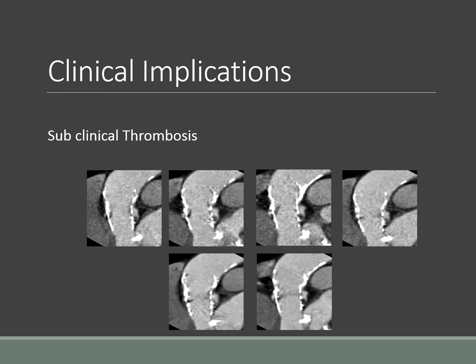A CT follow-up was recommended for this patient, who didn't receive any anticoagulation but was scheduled for follow-ups of the CT. This reflects the importance of commenting on the TAVI leaflet movements in post-TAVI CTs.